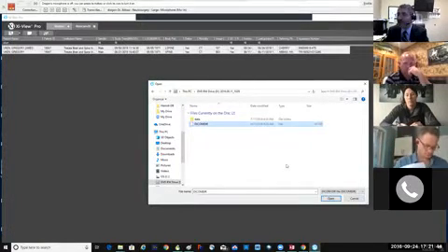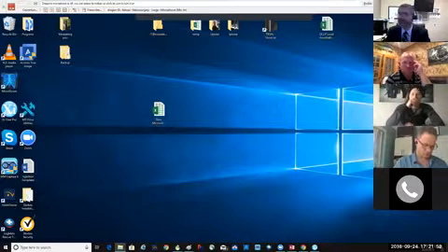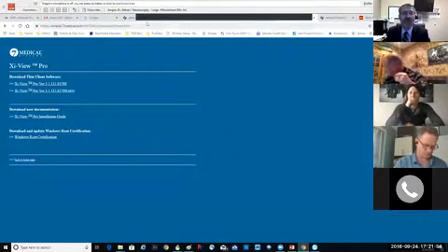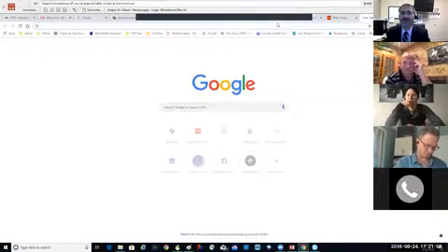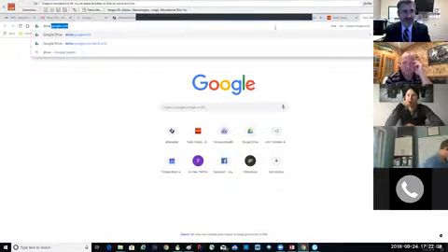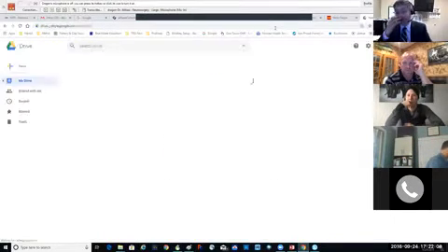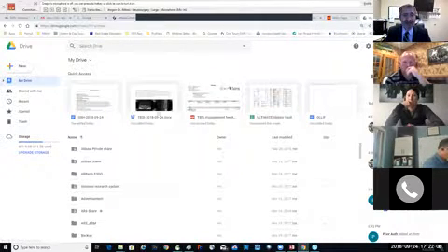Now, on our side, I'm just going to cancel here. I'm now uploading from a CD, but the same way I can upload from anywhere. And the way I can do that is to go to drive.google.com. So we can use Google Drive.